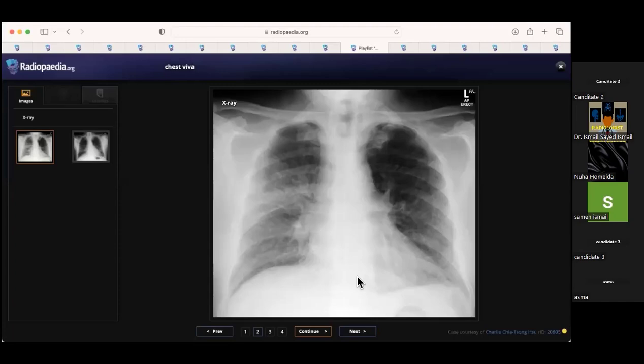So your differentials for unilateral interstitial changes would be lymphangitis, and it could be unilateral pulmonary edema. You'd say to the examiner, I'd expect it to be bilateral, but it can happen unilaterally. So that's a case of unilateral pulmonary edema in heart failure. If you see unilateral pulmonary edema involving the upper lobe, you tell the examiner this is associated with mitral valve regurgitation. You also tell the examiner that you want to review the history. I think this patient was treated, and so that's his CT.